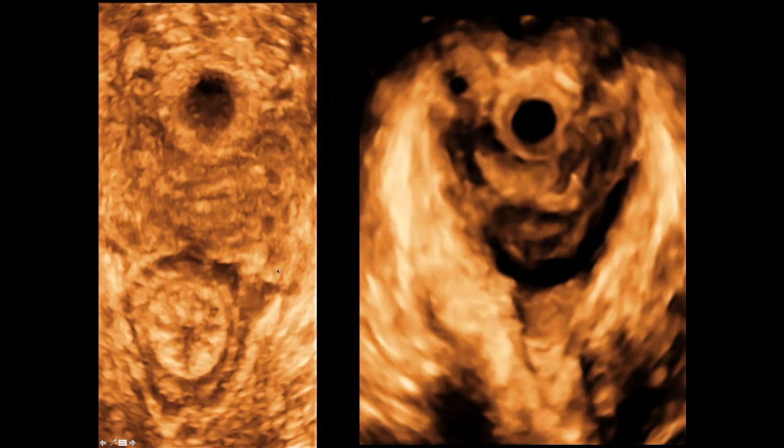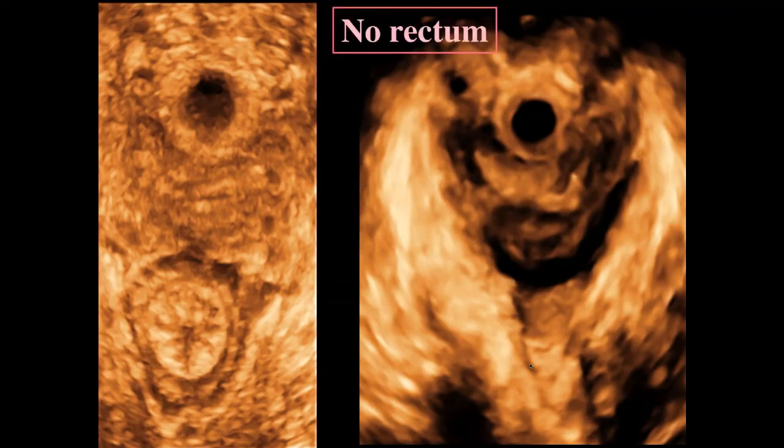Okay, so here is a normal floor of the pelvis. This is the urethra, that's the vagina, and that's the rectum. Something missing here. Think about it for a second. You see what's missing. The rectum is missing, the anus is missing. This is somebody who had the anus and rectum removed due to ulcerative colitis and has a bag. But just to show you that you can be quite accurate as to what you can and can't see back here, because the rectum is actually absent.